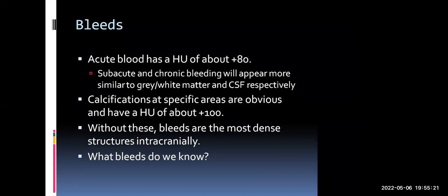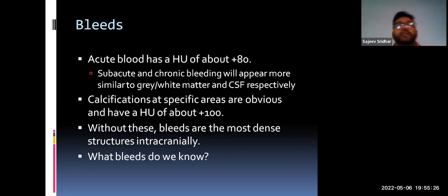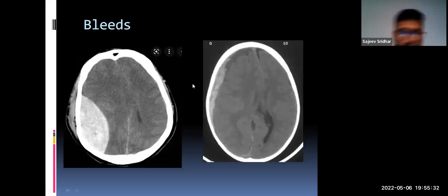Epidural hematomas, subdural, subarachnoidal, and intracerebral. Excellent. Well done. So as Tim pointed out, we've got a couple over here. Okay. So the CT on the left is a classic appearance of an epidural hematoma.